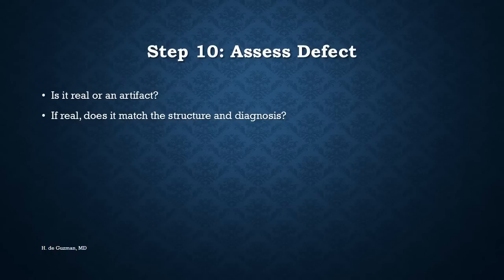The last step is to assess the defects that we see on the visual field. We have to tell or determine, is it a real defect or just an artifact? And if it's a real defect, does it match the structure and our diagnosis?